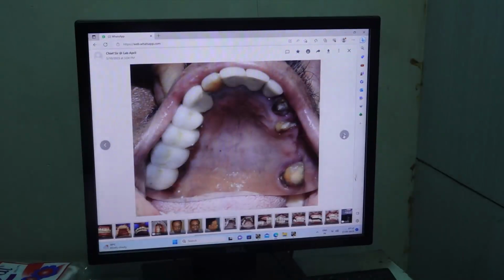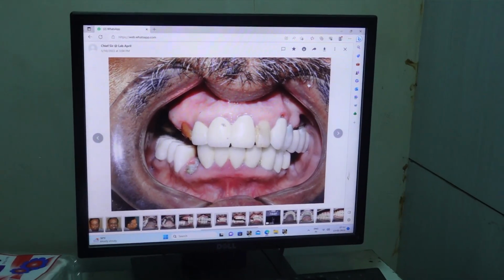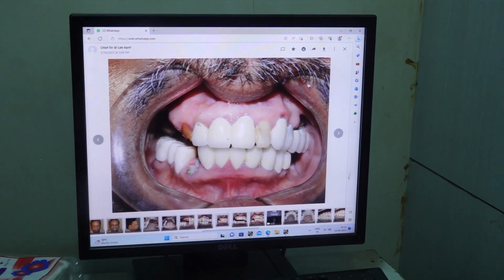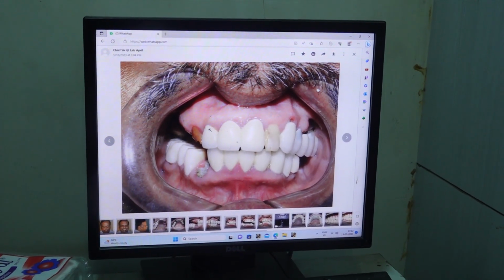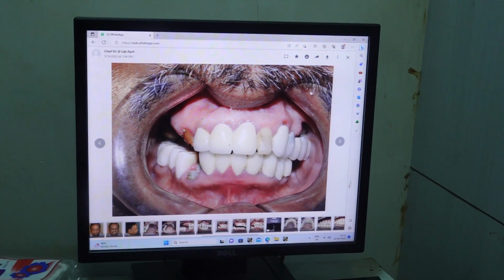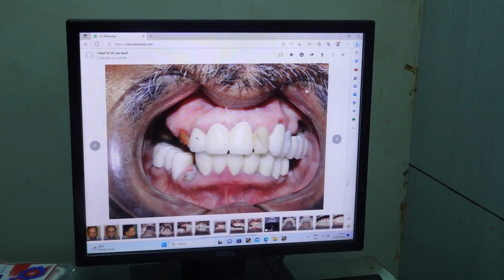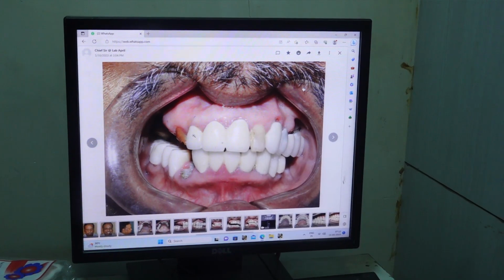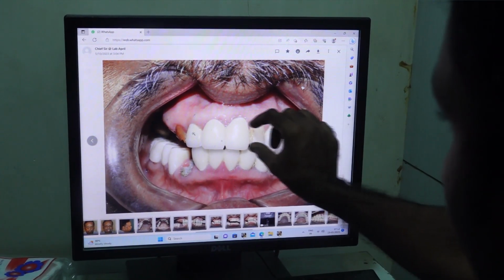So we will see the intraoral picture now, right? See, the bone is still here. The bone is okay till here because it's not a periodontitis case. There is no bone loss. So if you extract and place implants without doing alveoloplasty, then we may have difficulty in giving the prosthesis. So it is a kind of FP1.